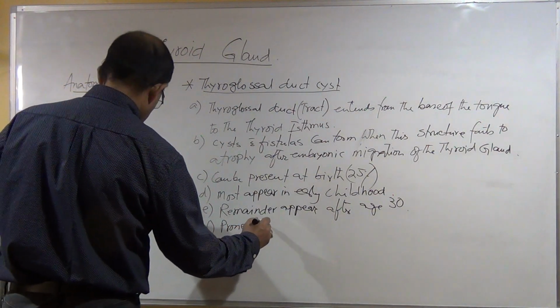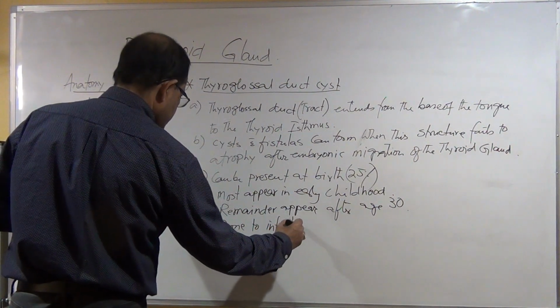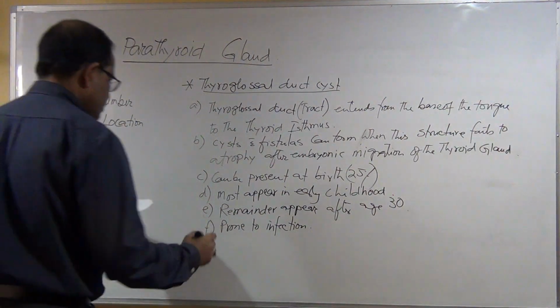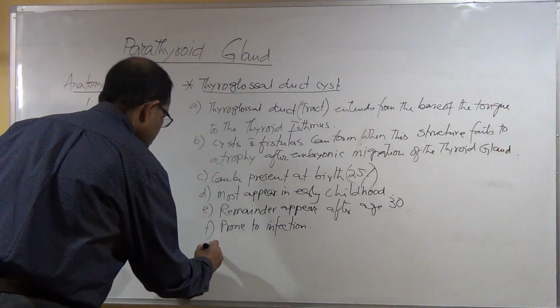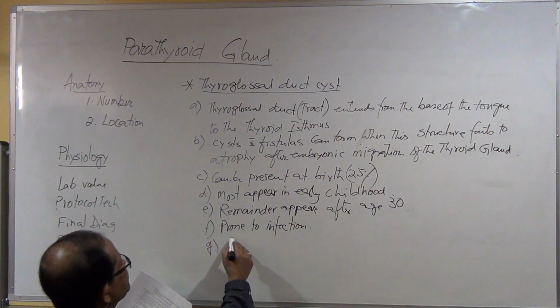It is prone to infection and may rupture spontaneously.